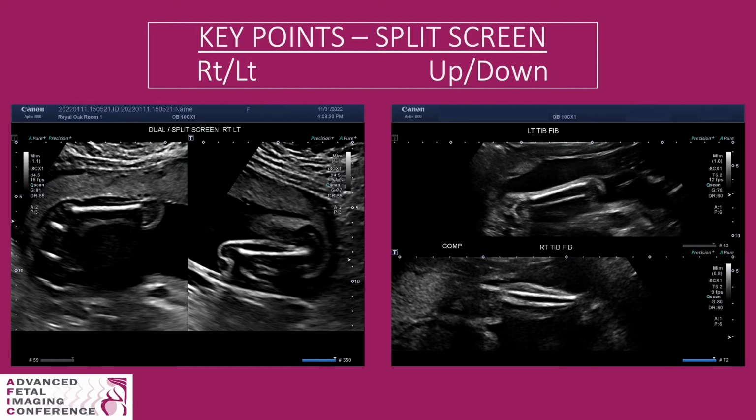On the right, I have demonstrated the up-down feature in dual screen. It's a simple touch of a button to go between right and left and up-down on this function. Embarrassingly enough, I was just shown the up-down function of dual screen this year. I promise you, my mind was blown. I have also now incorporated the up-down feature of dual screen in many of my general ultrasound exams, including for small parts and MSK.